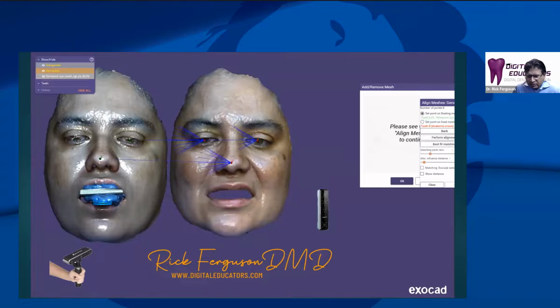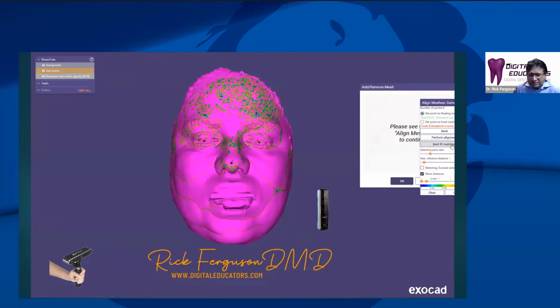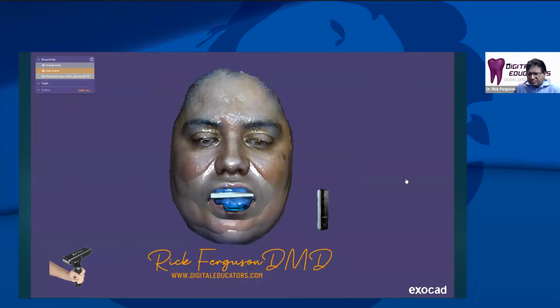And you can see the RevoPoint looks a little rough on the surface as far as the texture. There are smoothing tools that you can use, and I find that they're really good. They'll smooth out the textures, but you lose some detail when you do that. So, somewhere in between, and you can play with that and figure out what is your personal preference.